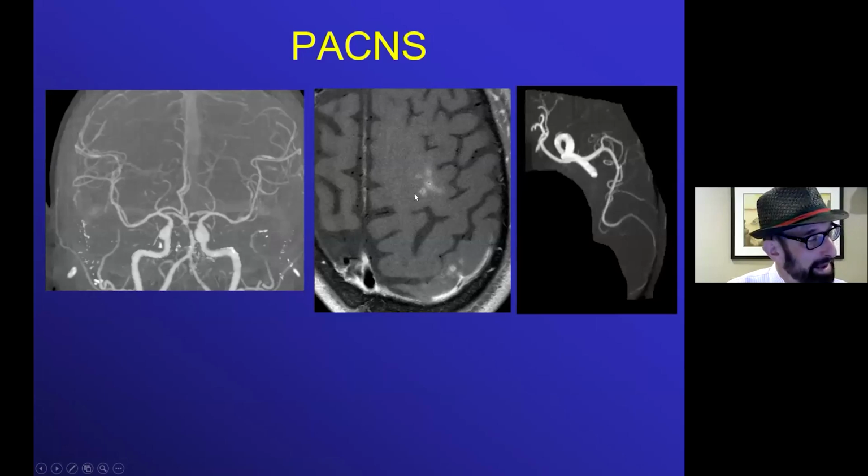Another example, sometimes the manifestation looks like it's parenchymal with the blood vessel central within that parenchymal abnormality. And I give this example. Here's a small flow void with enhancement around it, but you can see that there's actually other little black dots here.